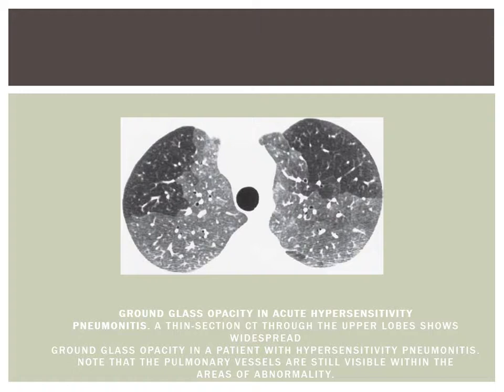This is a very characteristic picture. You can see this geographical pattern. It looks a little bit like a crazy paving appearance. There are some faint ground glass opacities, and if you look carefully, you can see faint centrilobular nodules, for example, like this one. It's due to the projector; it's not very obvious in the book. These ill-defined nodules are better seen. If you ask the patient about a history of exposure to birds or things like that, and he says yes, this is typical subacute hypersensitivity pneumonitis.